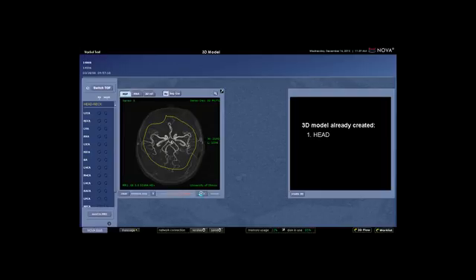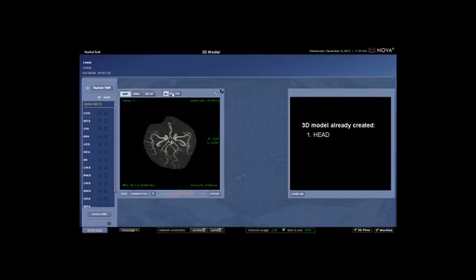And the first thing I'm going to do is crop the MIP in 3 planes. So I just take my mouse, left click and drag, and crop. And now finally, we'll do this in coronal plane and crop. And this typically takes about 30 seconds or less to generate a 3D surface rendering of the blood vessels. So now I've clicked T.